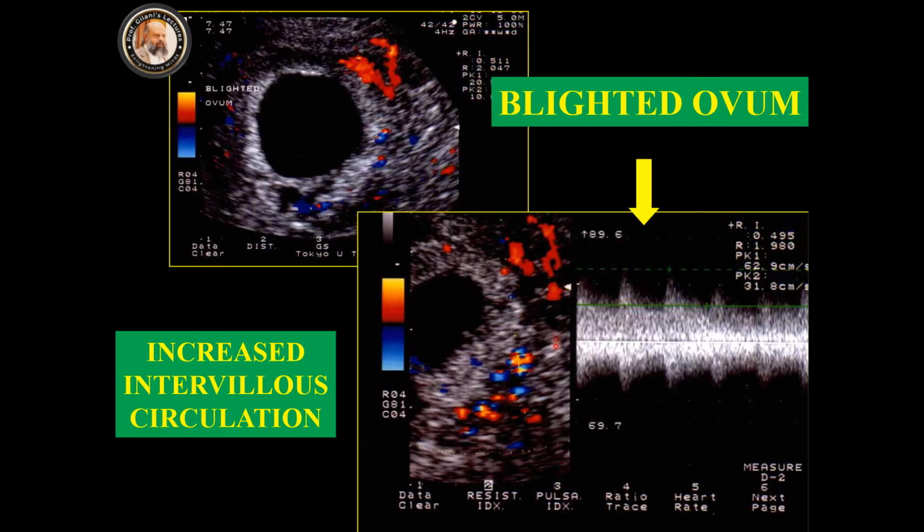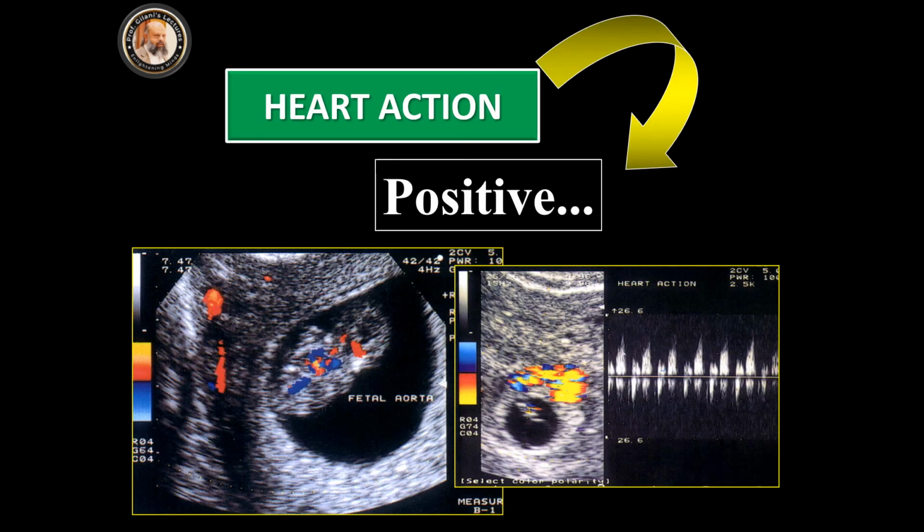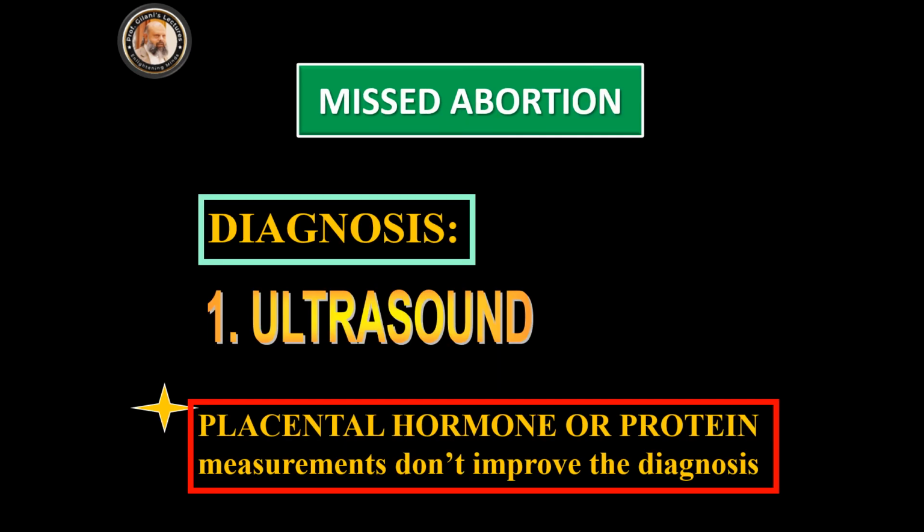Here is a blighted ovum, and this is increased intervillous circulation showing pregnancy. Another blighted ovum, decreased RI within the intervillous spaces. In an intrauterine pregnancy the cardiac activity is present, but in blighted ovum there will be no embryo or yolk sac.